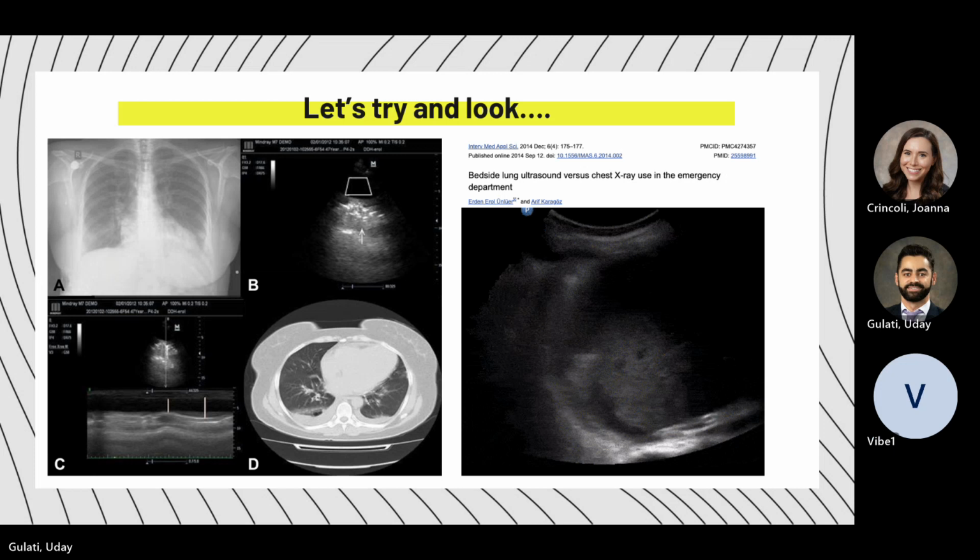Sorry? Right lower lobe looks like stuff. You're saying this right here? Yeah. It looks like what? Also trace around the cardiac center on the right side as well. I don't know if it's a little bit of opacity there. It doesn't look as smooth, but we would need a lateral view to see. You're thinking right here? That too, but also on the right side, on the right cardiac border.